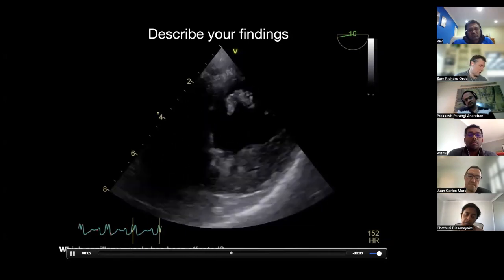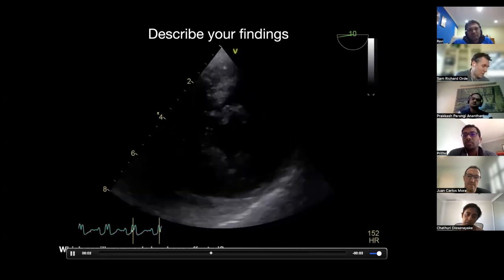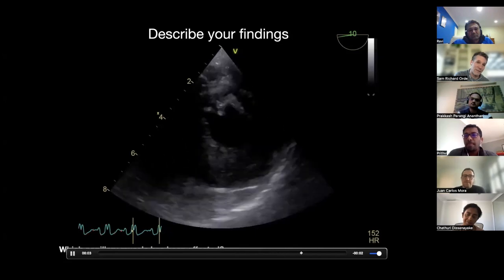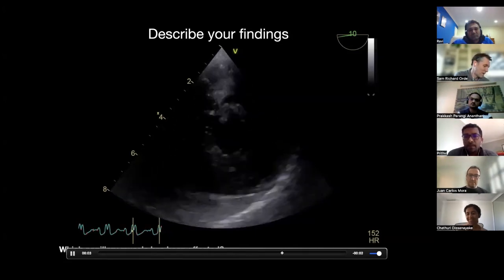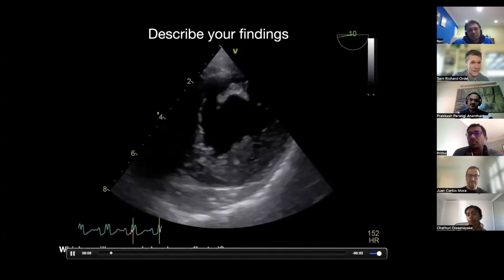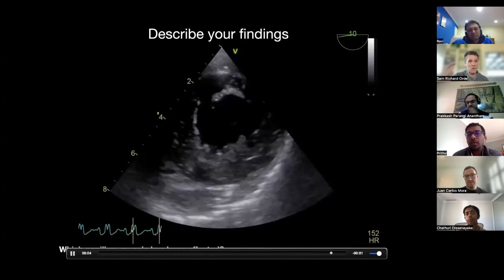So the only other thing I was going to add in, again, some of my favorites in there. You said that the LV was quite hyperdynamic, which is the well-known phrasing that I love. Again, it's hyperdynamic. It is or it isn't. You talked about the anterior mitral leaflet. Absolutely, but if you give me a little bit more, that's going to show your level of understanding of anatomy. You could have given me maybe A2 in there as well. Give me the scallops. You said it was anterior, or ask for other views, but give me an idea.